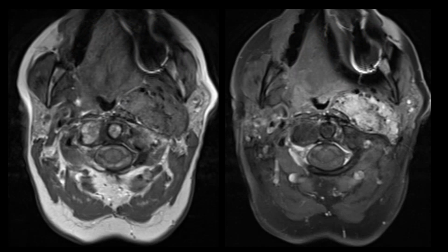This is another patient, and this patient had been followed up actually for 5 years, and this patient was actually followed at my shop, and this patient had been called a benign mixed tumor over and over again. And I looked at the study, and the fellow read it out with me, and he said it looked unchanged as a benign mixed tumor.